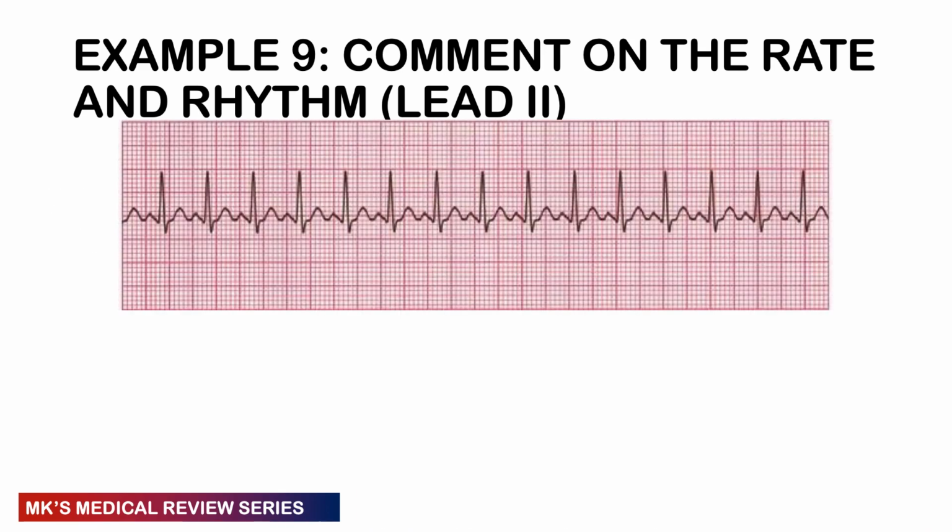Moving on to the next example. Again, pause the video. I want you to comment on the rate. I want you to comment on the rhythm. I'm sure you must be getting the hang of it by now.